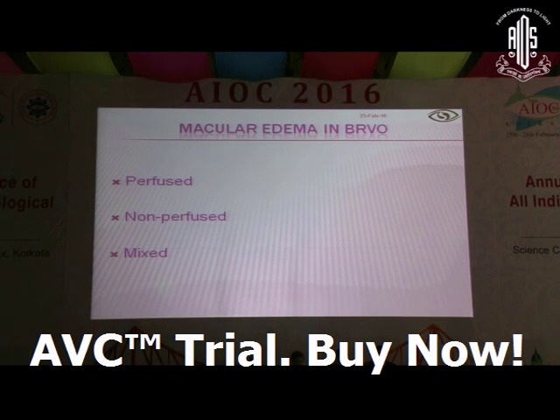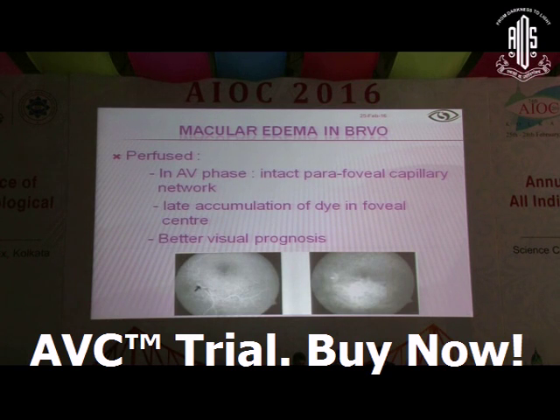The other presentation of a branch retinal vein occlusion is when it involves the macula. And the macula can be either perfused or non-perfused. Like in this case, if you see this area, the vascularity is well maintained and there is a leakage in the late phase. As the capillary foveal avascular zone is well maintained, we would call it a perfused macular edema in a branch retinal vein occlusion, and these patients tend to have a good visual prognosis.